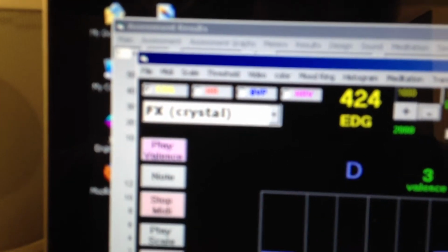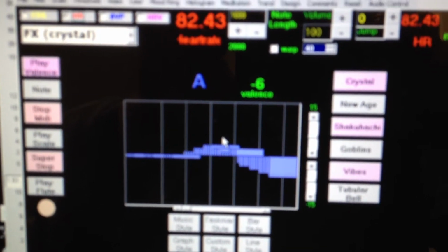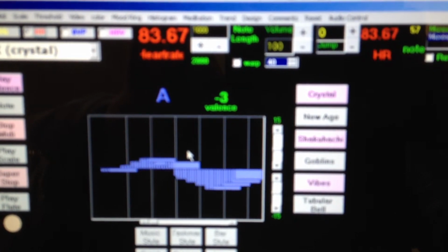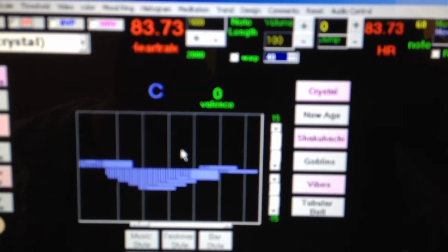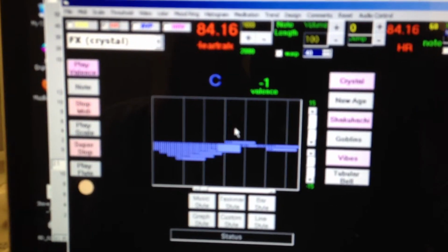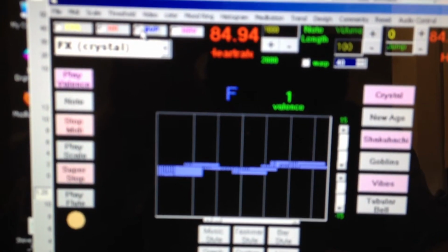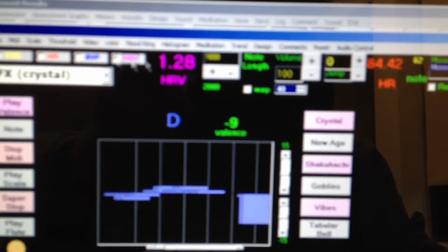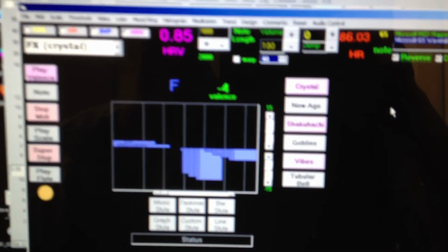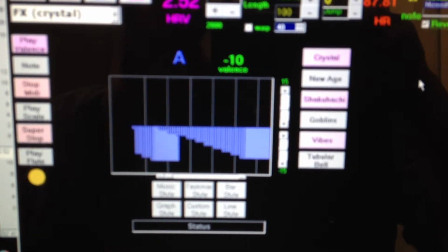So now let's switch the signal over to heart rate instead of electrodermal activity. And now the tone is playing my heart rate, actually moving up or down, depending on whether my heart pulse is moving up or down. We could also put it on blood volume pulse or heart rate variability. And here we might want to reverse the direction of the tones, because some find it more relaxing to hear the tones going down as the measure, in this case HRV, is going up.